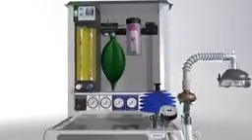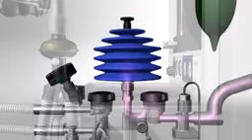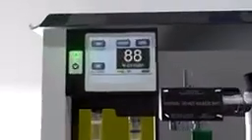The anesthetic gas flows from the back bar at low pressure to the breathing block and the bellows. A sensor reads the oxygen concentration of the gas passing to the patient. The reading is displayed on the oxygen monitor screen. As the gas continues from the oxygen sensor, it passes the first one-way valve, then the bellows chamber or ventilator, followed by the second one-way valve.